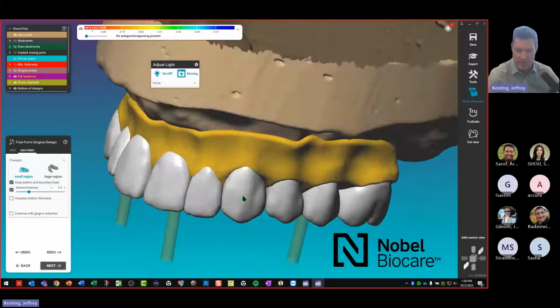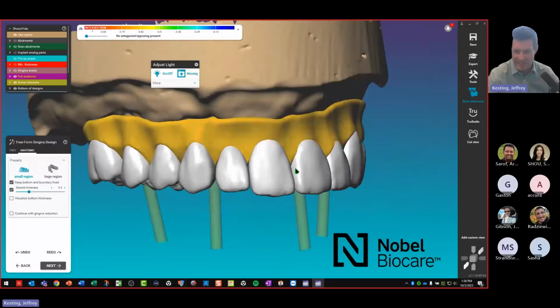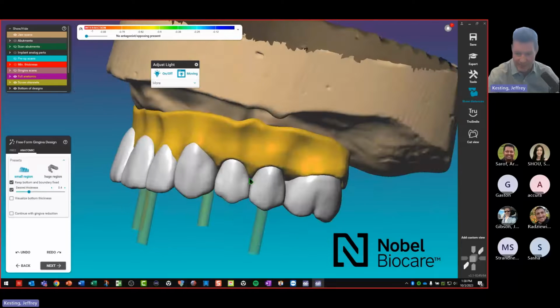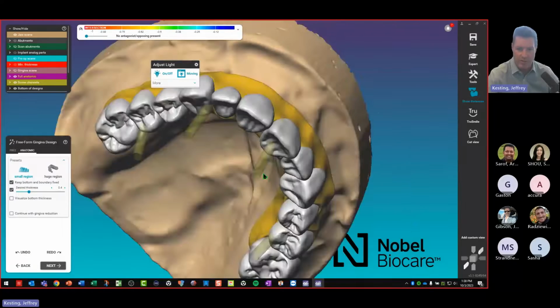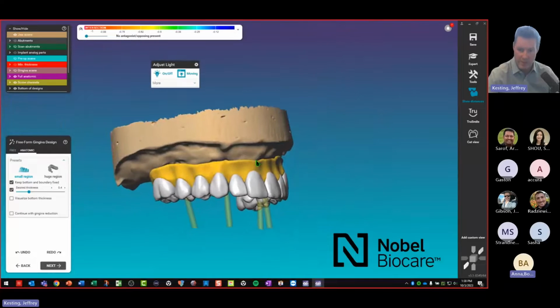So maybe I just want to make sure I don't have any. And this is what I was talking about, the little pinhole that Sean had designed right in there. And we actually, just like this here, milled that. That's what we can achieve. It's pretty amazing stuff. So you can be assured that your design will definitely come through with our milling strategies and our mills, of course.